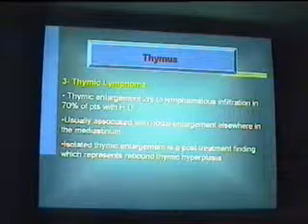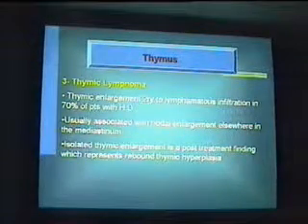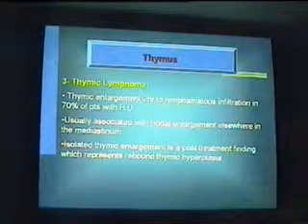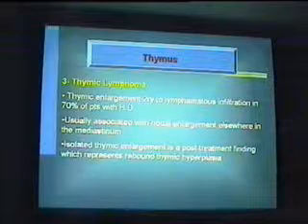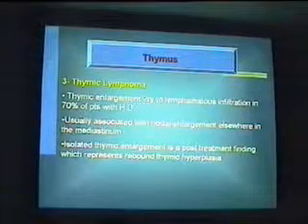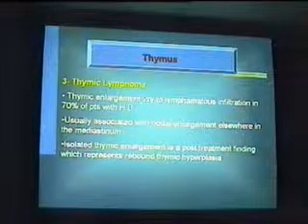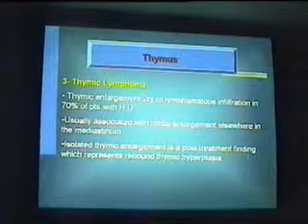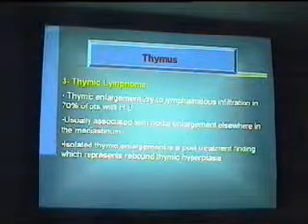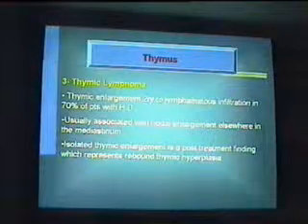أوكي وبعدين الأفلام دي happened to go to Paris لواحدة radiologist and specific only in lymphoma. She's a radiologist working with lymphoma. فبعتت وقالت إن this is a rebound thymus. أوكي فأنا بقول لكم دايما بحب أحكي الحكاية دي عشان تلزق في مخنا يعني إيه rebound thymus. يعني rebound thymus the thymus regrows whenever the patient is passing out of stress يعني under stress بيحصل لها atrophy then it rebounds to flourish.